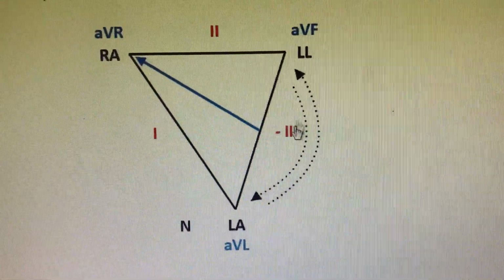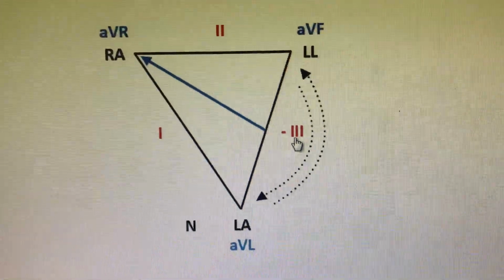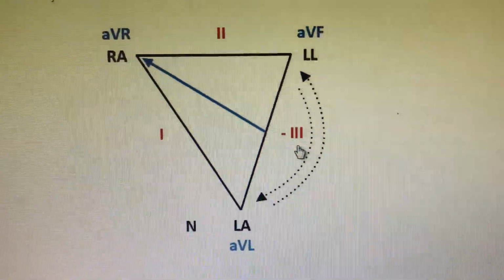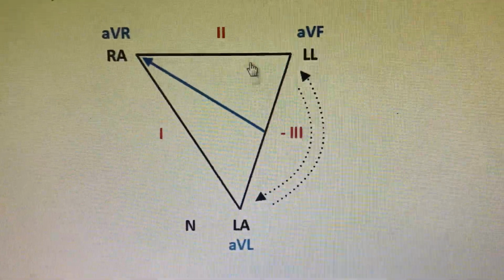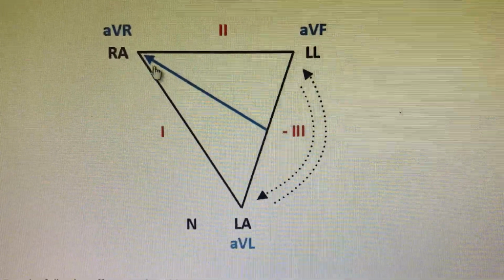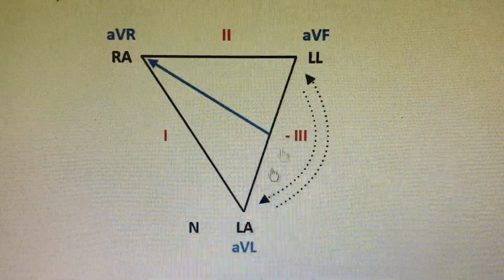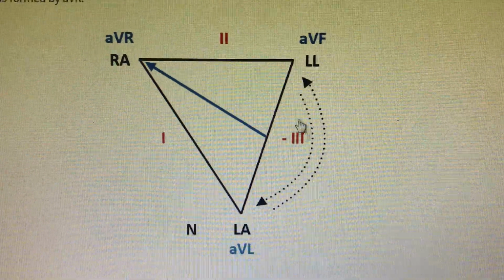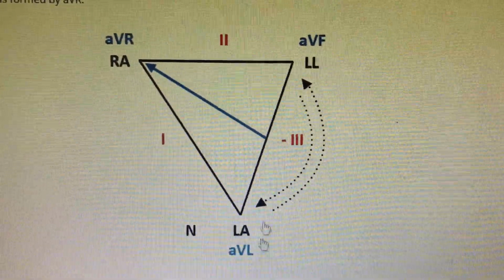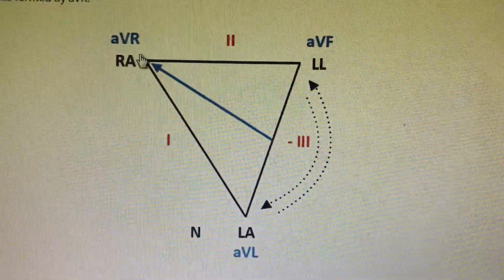First, lead 3 is absolutely inverted, because this is where the absolute action is happening, at lead 3. Lead 3 is absolutely inverted like the AVR. And the lead that is unaffected is the AVR. AVR is the pole where the cavity is focused, but all other things are grounded. So it doesn't matter to AVR if the left upper limb and left lower limb are reversed or not. So AVR is the same as the previous.